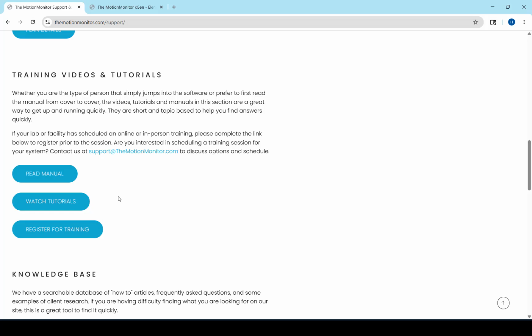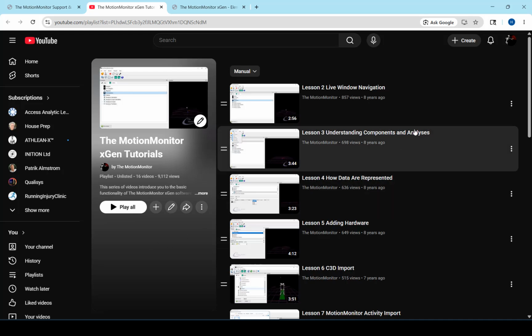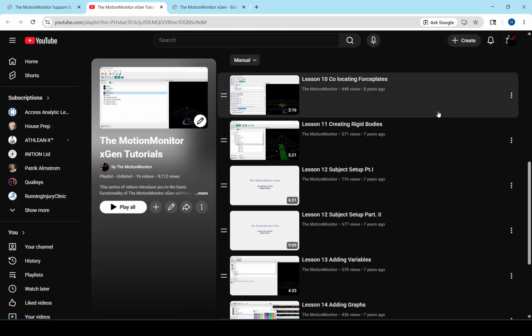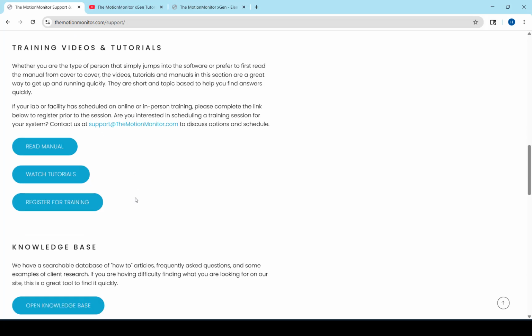Next, we'll look at the tutorial videos. These tutorial videos talk through some more basic features of the software along with steps to set up for data collection. Next, I'll point out our knowledge base.